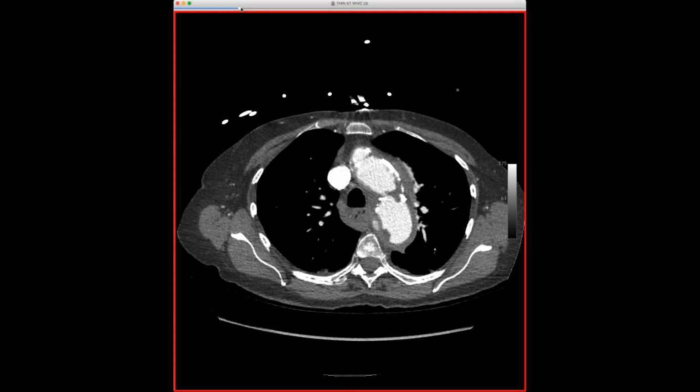Okay. Yeah, every time I read about it and discuss it, I think I understand, and then maybe I get more confused because I think about acute aortic syndrome, including dissection, penetrating ulcer, and intramural hematoma. I mean, they're managed the same way, but I guess the debate is where does it start? So you think this one actually started as a true dissection? Yes. But I think the important thing here is the length of the abnormality. Okay. The length goes with dissection. Okay. And against ulcer.